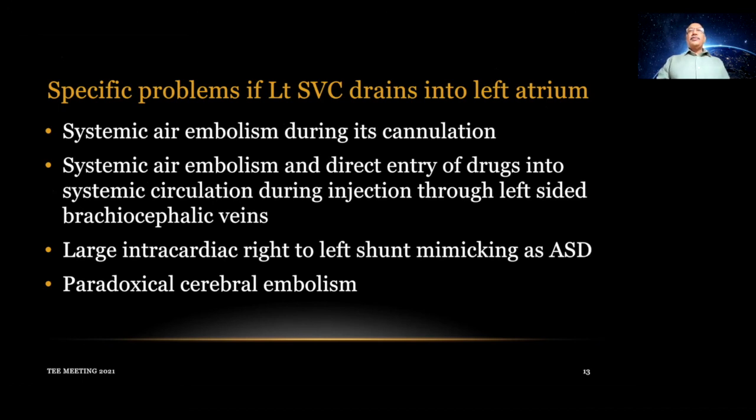Now there are some other problems associated with left SVC if it drains directly into the left atrium. That is what we call when the coronary sinus is unroofed. That means whatever drain is coming through the left SVC, it drains directly into the left atrium. Normally when you put a cannula into the SVC and IVC for systemic venous drainage, it is put while the heart is still not arrested, the heart is beating.